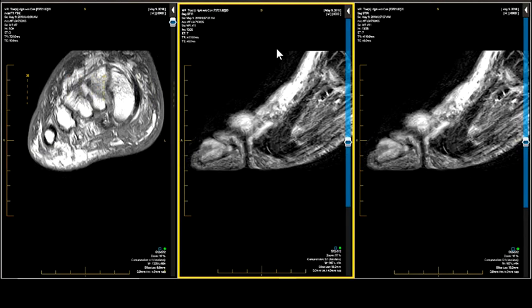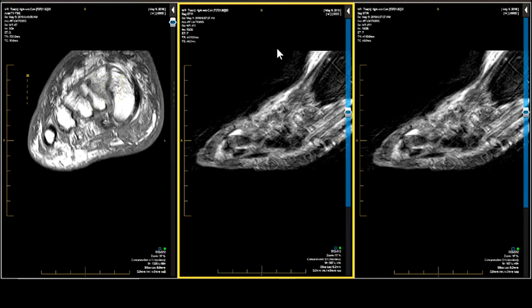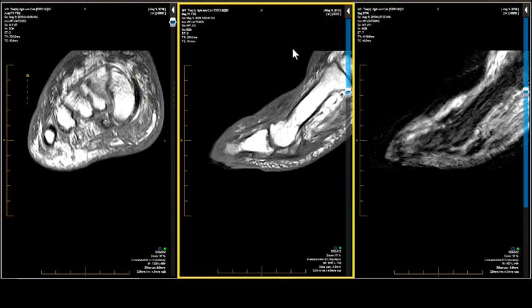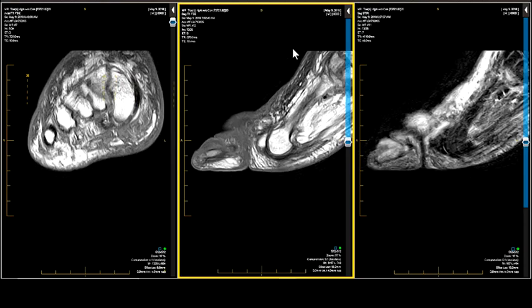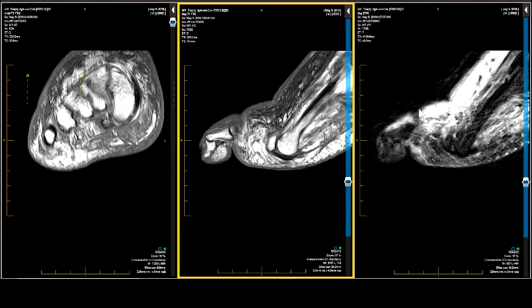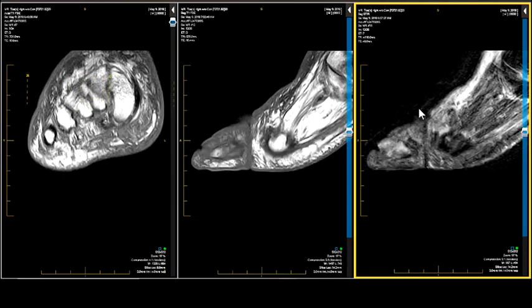Enhancement that may represent infection, but can also be seen in other inflammatory disorders, can't rule out, and then you get a long list. Or you could simply just look at the T1 weighted image. Let's do that. This is the detector image, and this is the specifier image.